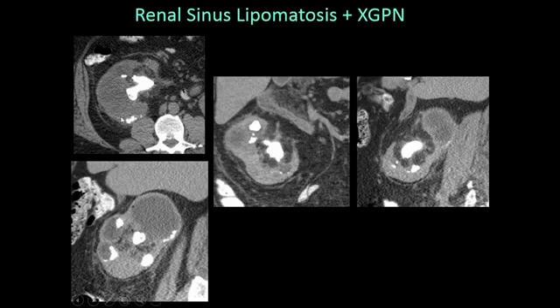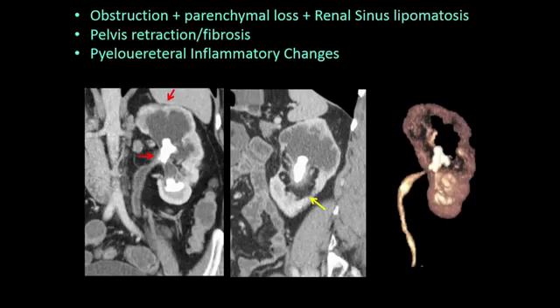You're going to say there's a large edematous kidney, there's extensive staghorn calculus, there's blown out calyces, perirenal inflammation, but also that there is sinus lipomatosis. This tells the urologist, if I don't go in now and intervene, I'm going to lose this kidney from the atrophy from this long-standing infection in these patients.